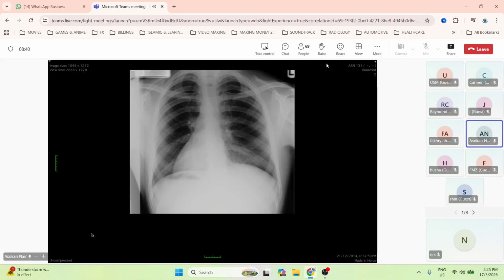Okay, so now assuming that the marker is correct, you went and checked, it's fine. So you notice there's dextrocardia, and you also see these tubular and cystic opacities. That is due to bronchiectasis. And there is associated situs inversus because the gastric bubble is on the right side. So all these will point towards Kartagener syndrome.